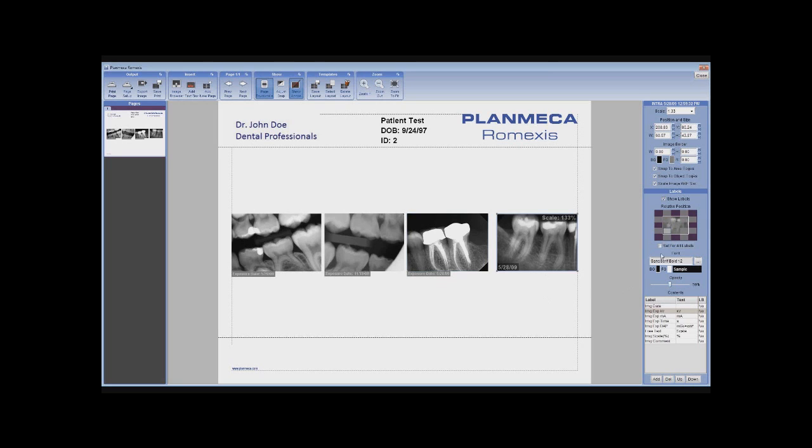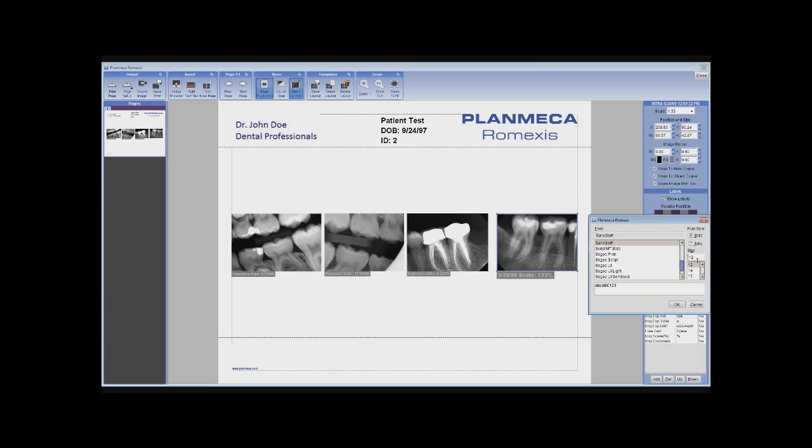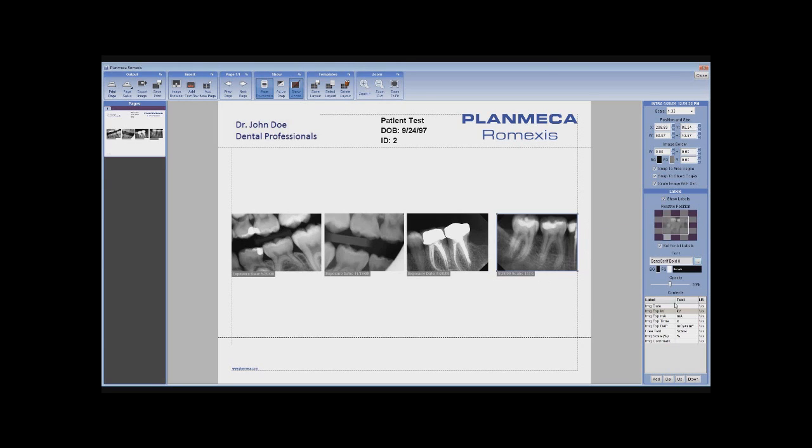Okay, so got my label below. Selecting this image again, selecting for all the labels, putting them below, changing font size again, hit OK, and then go ahead and remove any extraneous information, qualify what image date means with a free text.